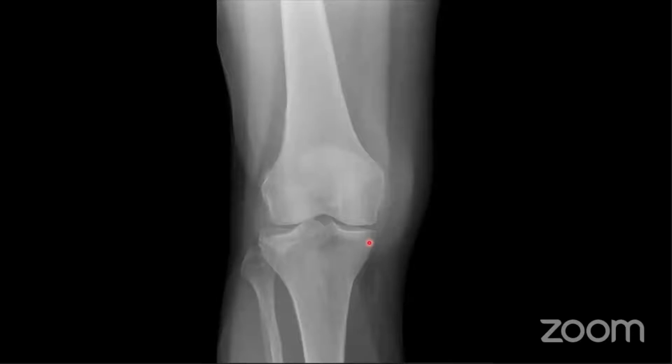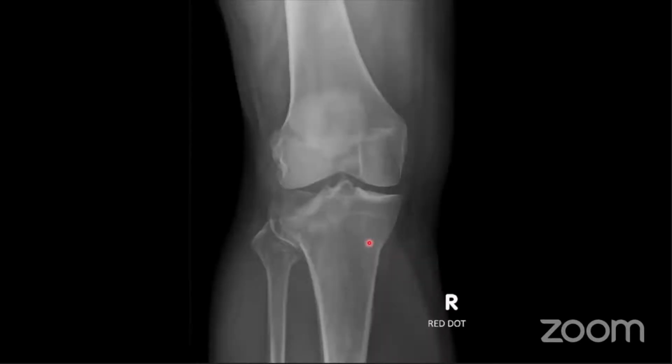Right, how about this one? So again, it's a similar history, fall, knee pain. Avulsion to the lateral epicondyle. So I think this is all a bone fragment. I'm not sure this is. Oh, do you mean up here? Yeah, I think that there could be another associated injury here. I think this is quite a bad twisting injury. So this bit of bone has come down against this bit of bone. So there's a twisting compression injury.